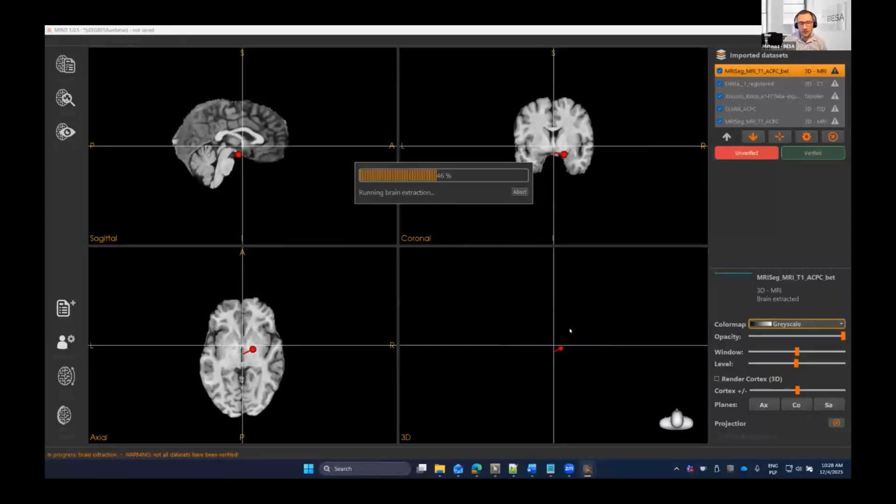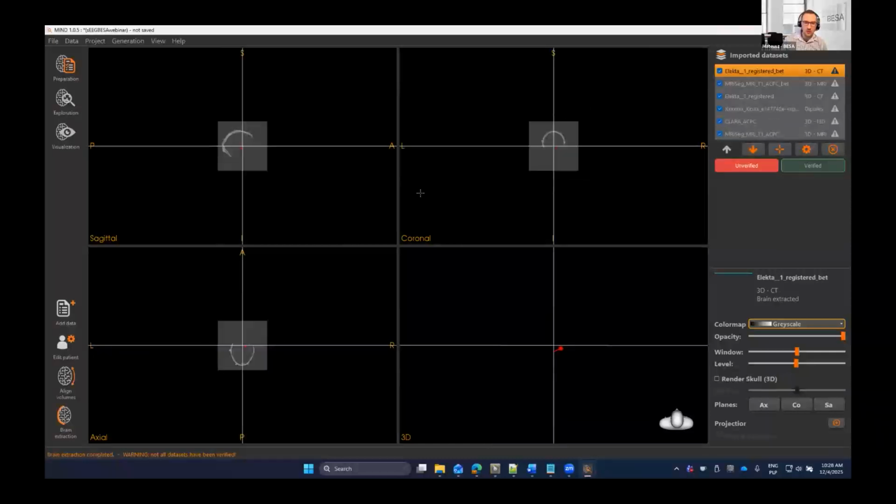By the way, if you go directly to DENS, you skip this whole part where you can do the integration with multimodal imaging, and then you are guided directly on how to do it, and the software automatically clicks the buttons for you. So it's a bit easier, but you will lose the option to load the results from the multimodality, or you can actually load them later manually as well. This is also an option, but it's not that automated, so I prefer doing it this way.